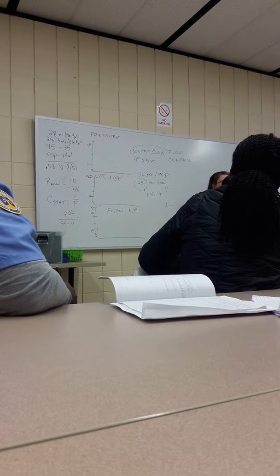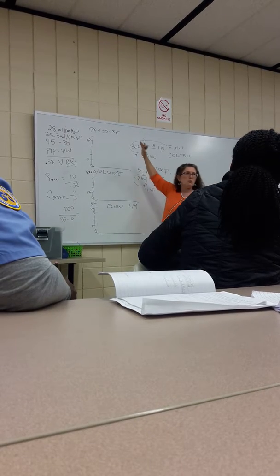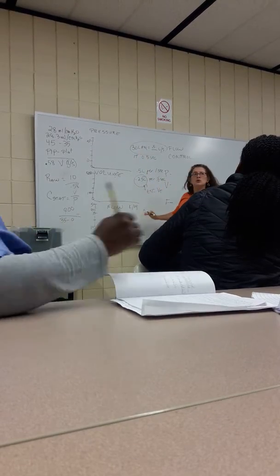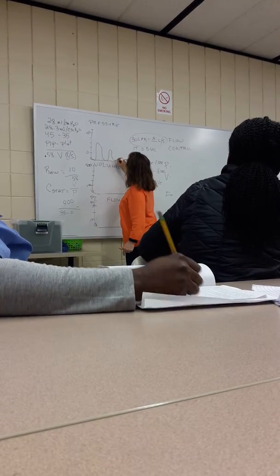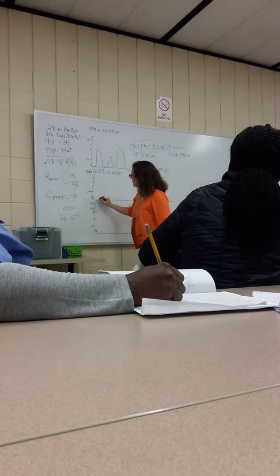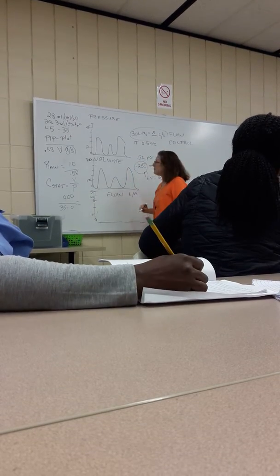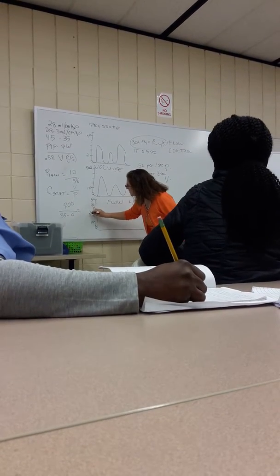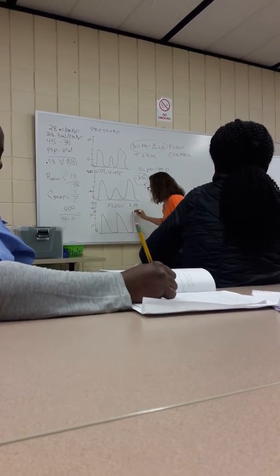But depending on the patient's compliance and airway resistance, volume and pressure are variable. So in flow controlled ventilation, pressure will vary with compliance, and volume can vary with compliance. The only thing that's gonna be consistent is that flow.